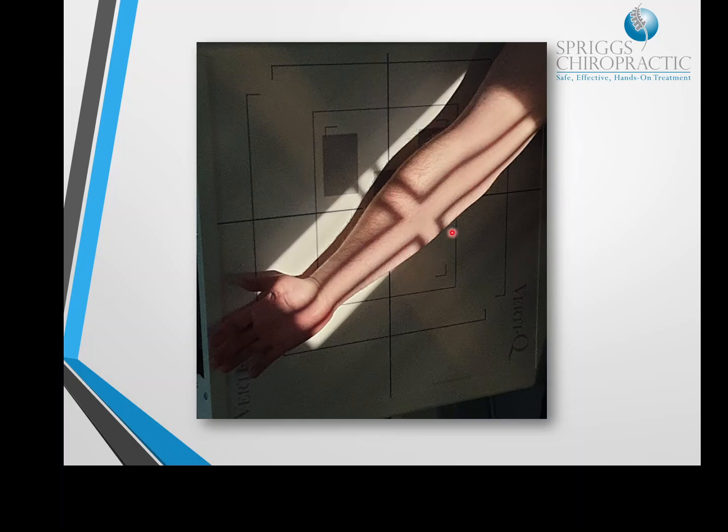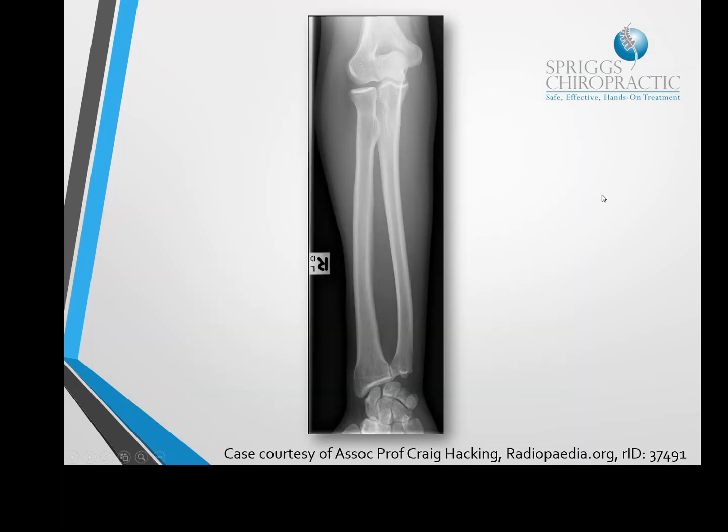So if you've got a patient who has had an injury of fallen on an outstretched hand, you'll be able to potentially catch a fracture of the carpals or distal ulna and radius, and you'll also see the shaft, and you'll also see the elbow. So it's really, really helpful for you to know for that mechanism of injury. And this is what it will look like.